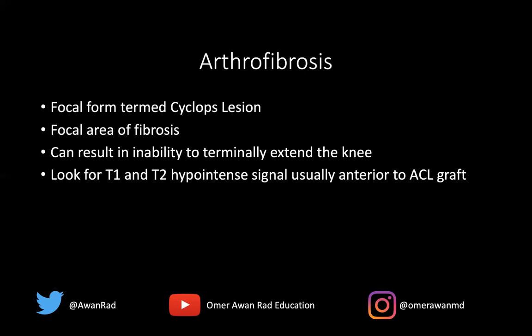Very important diagnosis as a complication to the ACL graft. You should know this, highly testable on the core exam and other testing opportunities.